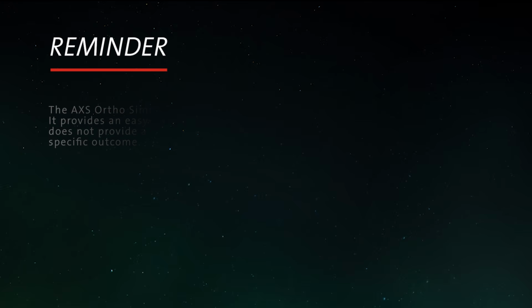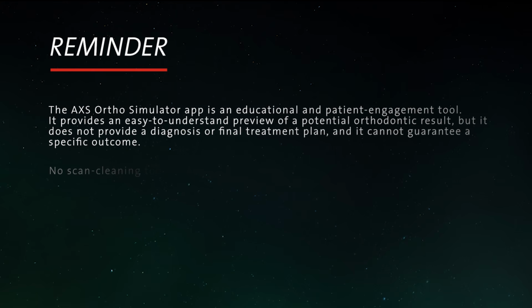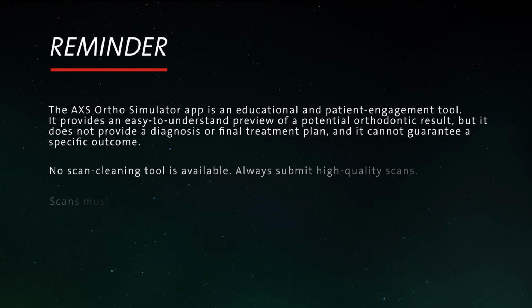Reminder: the AXS Ortho Simulator app is an educational and patient engagement tool. It provides an easy-to-understand preview of a potential orthodontic result, but it does not provide a diagnosis or final treatment plan, and it cannot guarantee a specific outcome.